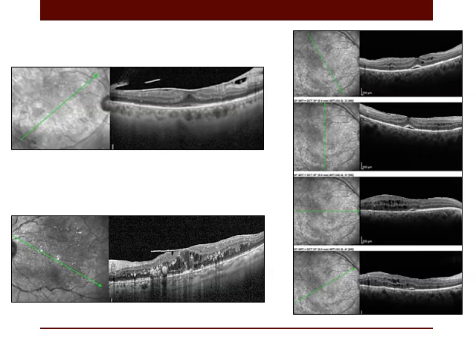Also, this is a type 3 epiretinal membrane. Why? Because there is ectopic inner macular layers. So the thickening here is mainly due to epiretinal gliosis. In this patient, thickening is of a composite nature. Why? Because we have thickening in the outer plexiform layer, very evident in this area, and thickening involving all macular layers with ectopic inner macular layers. So this is a composite nature of thickening, partly vascular and partly due to traction.